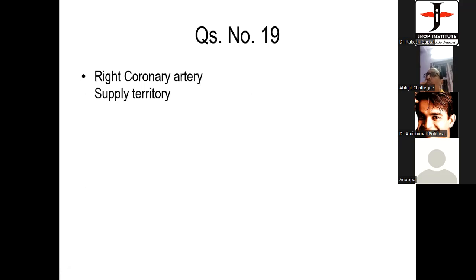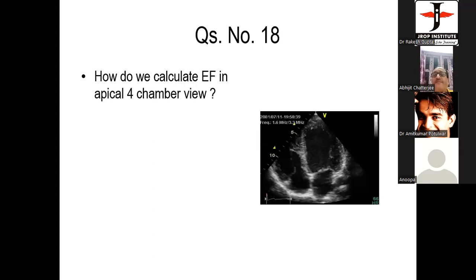I want to use the tissue Doppler to measure right ventricular systolic function. Tell me how I'm going to do that. Gupta sir, can you show the four-chamber view again, please? Now look at this picture. How am I going to do that?